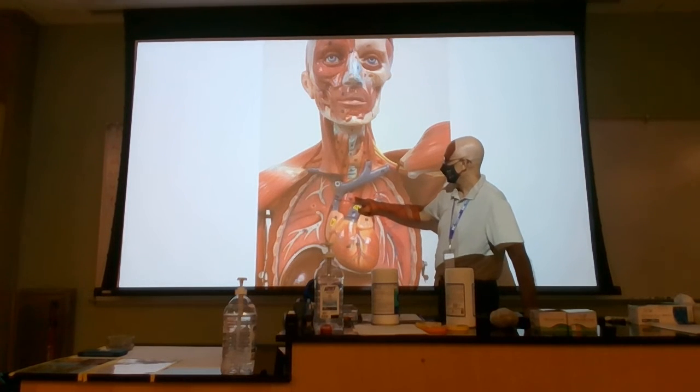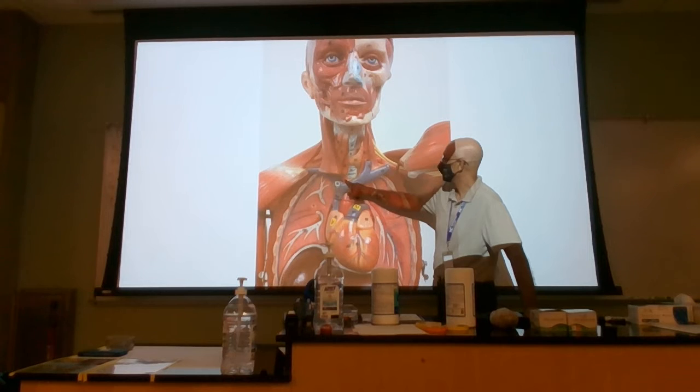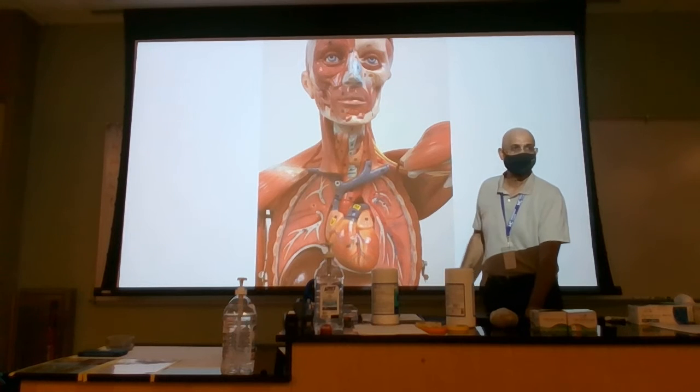Okay, this is the arch. This is the brachiocephalic trunk, and this one is the left common carotid, and this one just next to it, oh, it's the left subclavian. Right, guys? That's the left subclavian.